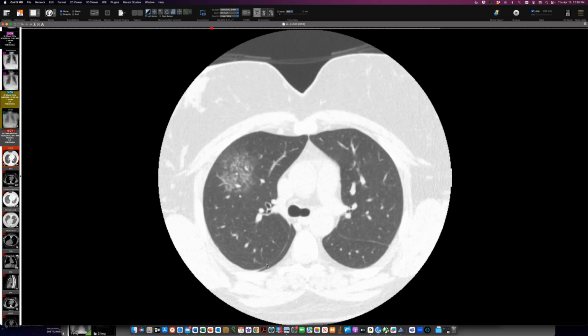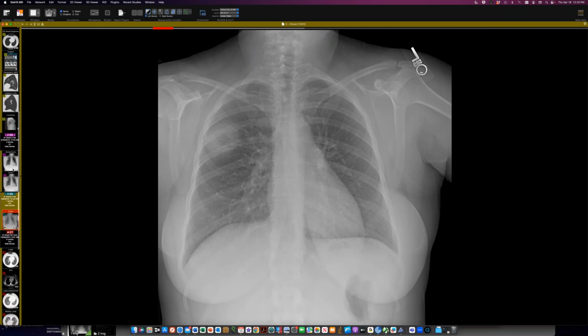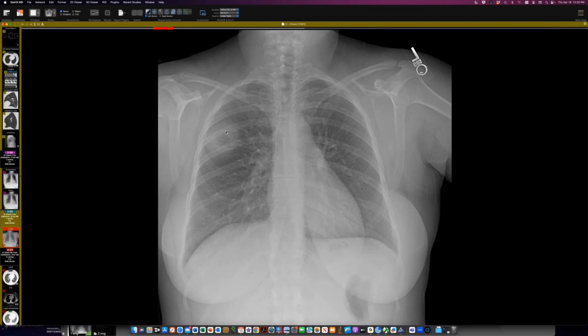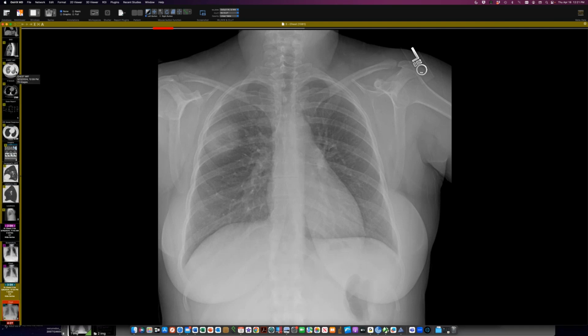So that big aggressive looking lesion looks more aggressive than the organizing pneumonia that we usually see. It's very discrete. This was the only lesion present currently. Looks a lot more horrendous. I would really hesitate to call this organizing pneumonia right off, just given how very firm it looks. I said, you really have to rule out an infection in this case. And it turns out this is organizing pneumonia, and the person's had it before.